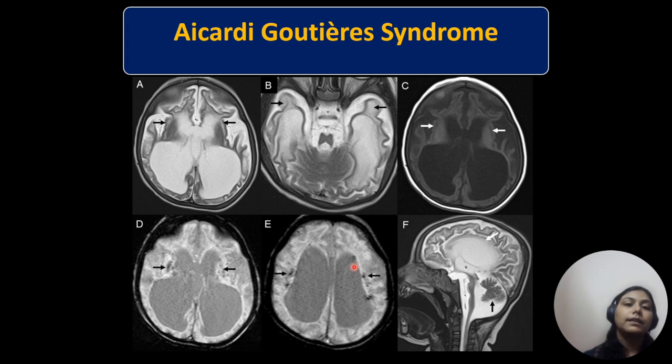Apart from that, the hyperintensity seen in these disorders is more likely to be demyelinating rather than hypomyelinating leukodystrophy. Also, there may be anterior temporal cysts or prominent extra-axial spaces in the anterior temporal regions, which again make them a close differential of TORCH infections as well.